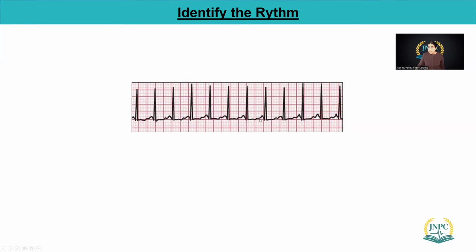So that way we have sinus tachycardia. Is this tachycardia? Can you see a P wave? First of all, is it a regular rhythm? Ask yourself the first question: regular? Looks regular, the R to R interval is the same. Now, another question: can you see P, Q, R, S, T every time? Yes, right? So this is sinus rhythm.